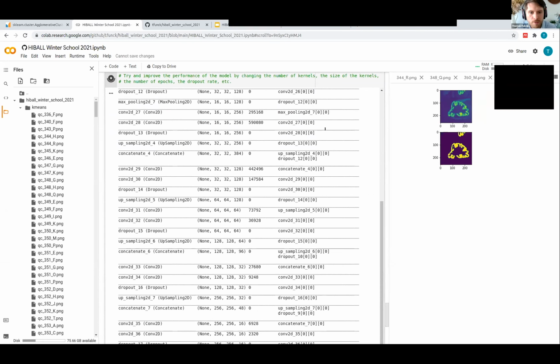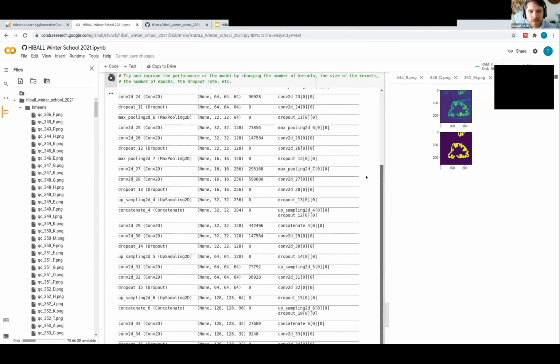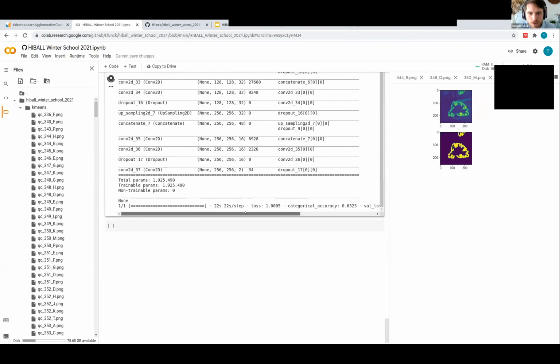Just know that if you're doing this yourself for your own application, one of the hard parts about neural networks is not the underlying math. The packages that are available are very good at taking care of that for you. What's hard is having correctly formatted images that are the correct size. So I would highly recommend making sure that all of this makes sense on your own data when you run it. Here we just trained for one epoch. So we basically did one training pass on the data, which is not enough, but it gives us some output that I can explain.